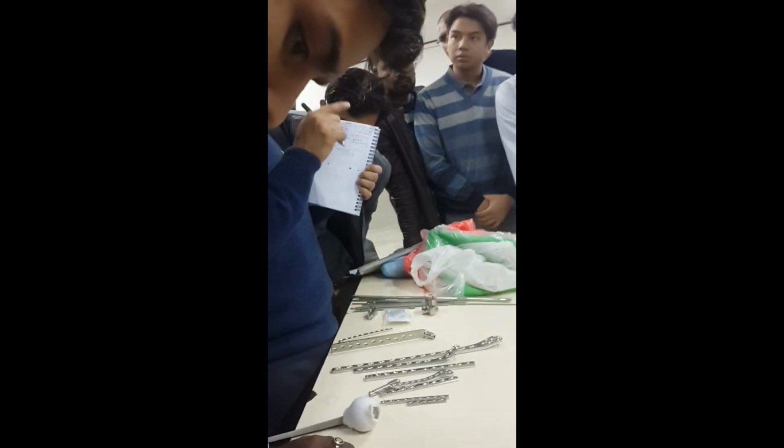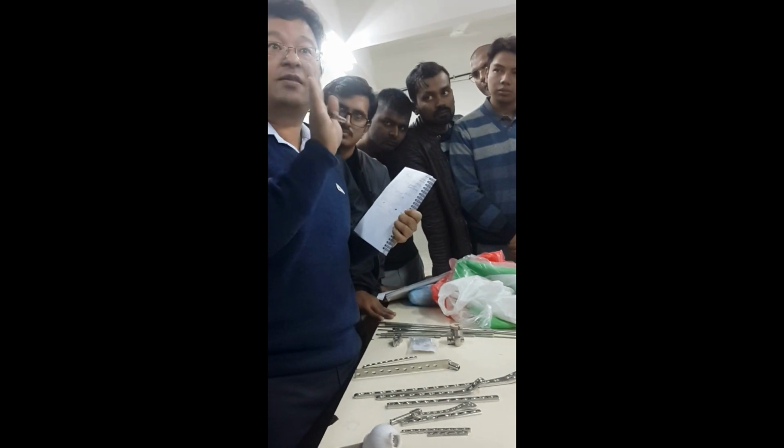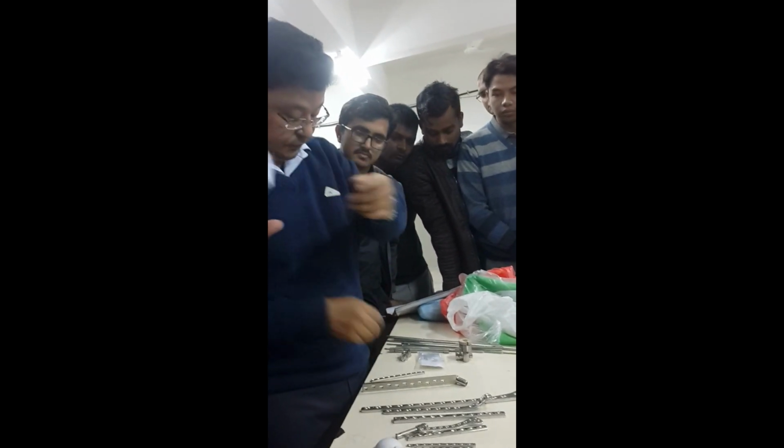The other plate method is simple, but when you apply the screws, it's different. Where you want to apply dynamic compression, centric and eccentric. This is not essential for you, but just remember that DCP has oval holes, not spherical holes.